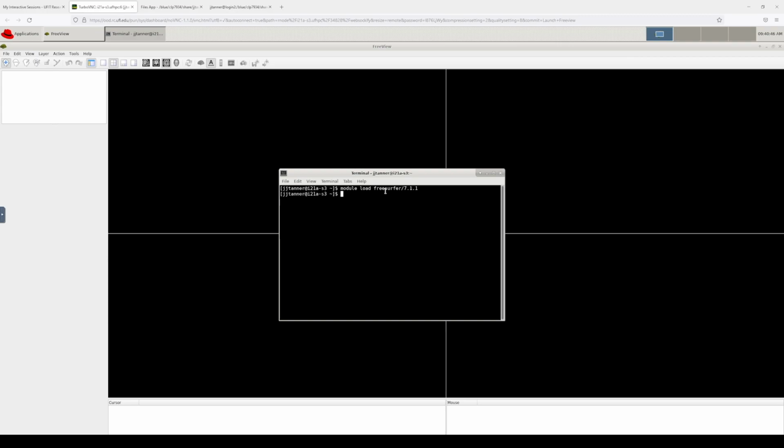And then what I'm going to do is I'm going to change directory to blue CLP7934 share, and then my directory. And then I have a subjects directory that I've created. And it's being a little bit delayed this morning. There we go. Okay, and then now I'm going to export subjects dir, all in caps, equals $ capital PWD. And that's going to set my subjects directory to the current location.